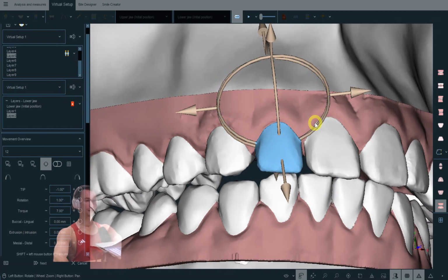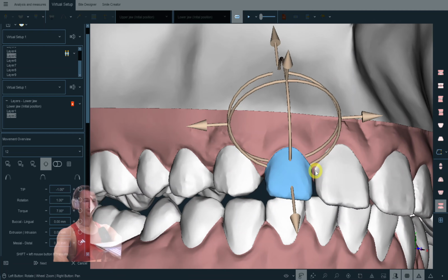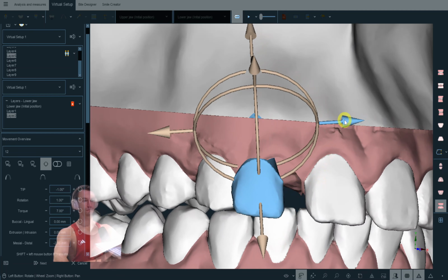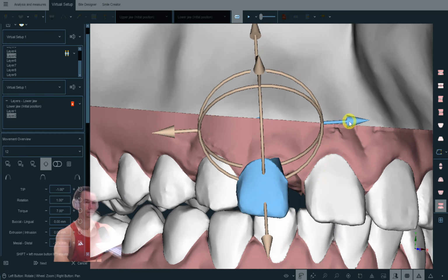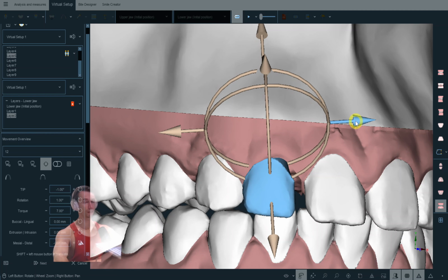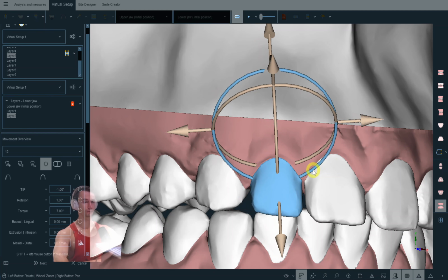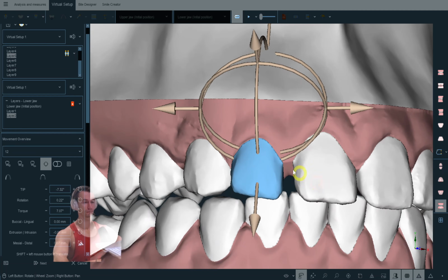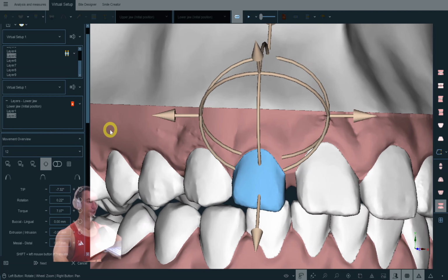I mean, the thing is that if we get too much space, we cannot move the incisors using just bodily movements as much as we can, because they will tip anyway, and we're gonna get something like that, which is not cool.